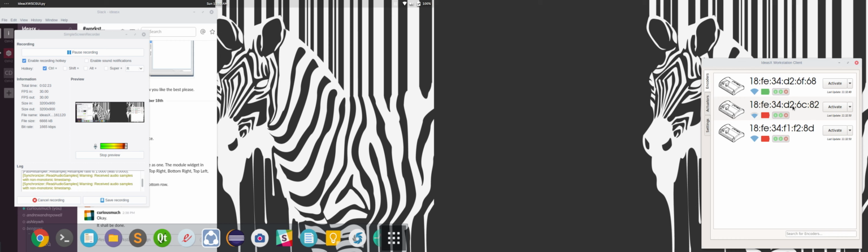Let me get into this little stoplight symbol. The idea is, if you've ever seen the IdeasX module, you can kind of tell from this picture right here, there are 2 jacks for inputs, for buttons. That's what 1 and 2 stand for. And the A stands for adaptive switching, which is basically switching based on motion.